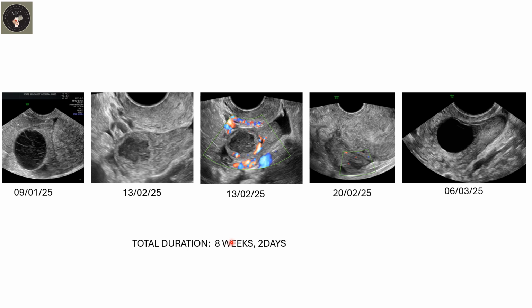As in this case, the cyst in the right ovary persisted, while that in the left ovary regressed. So while the former is likely to be a serous adenoma, the latter is a hemorrhagic cyst.